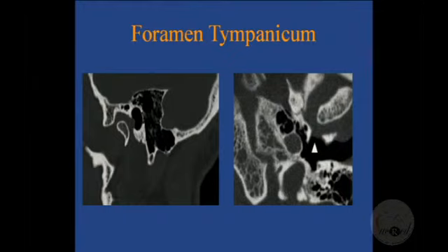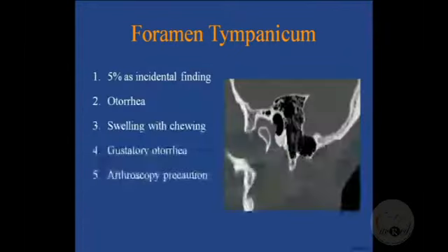So if a patient is being evaluated for CSF otorrhea and you don't have an answer, if the mastoids are very clean and the middle ear is all clean, and you see this, you question it. But it's a very rare find. It's almost like a 5% incidental finding.